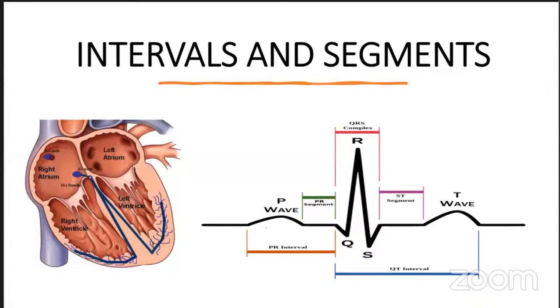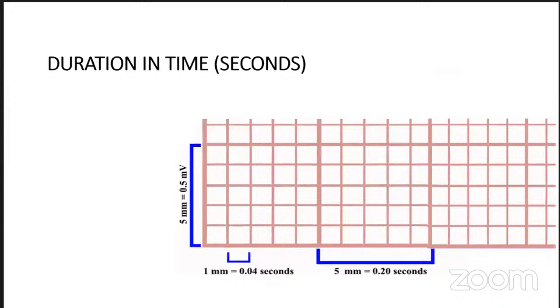So we talked about the ECG drawing all of these waves and segments. But we need to know what the duration of each of these waves and segments is supposed to be. Again, you need to remember that on the ECG paper, you're going to have these tick lines.